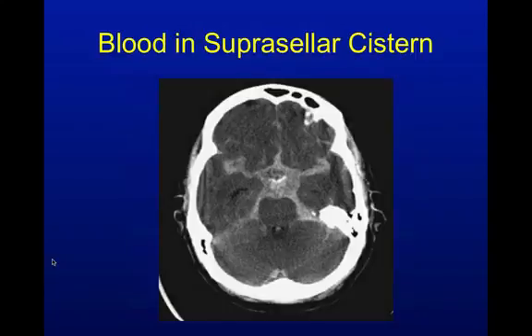The circle of Willis lives right here. That's where all your aneurysm, or most of your aneurysms appear from. So 75, 85% of the time, folks have aneurysms that are bleeding. That's the location. That's where you're going to be looking first if you're thinking an aneurysm will bleed. And as soon as you flash the CT scan and you see this, the starfish, and then the CT scan's like subarachnoid hemorrhage. We need to go to whatever arterial study you do at your facility. MRA, CTA, arteriogram, whatever they do, whatever your neurosurgeons are used to and your radiologists are used to.